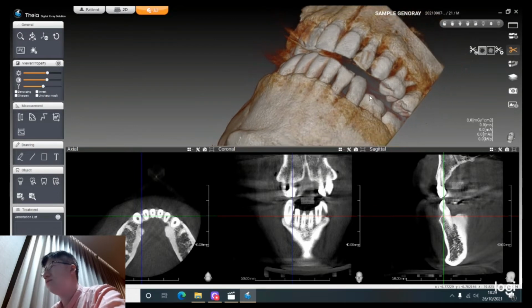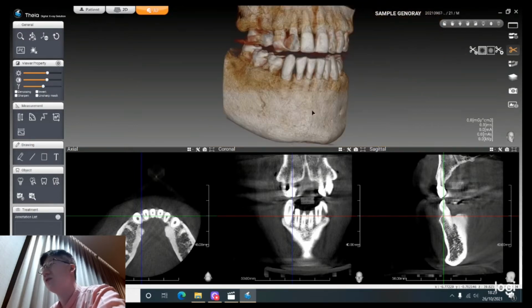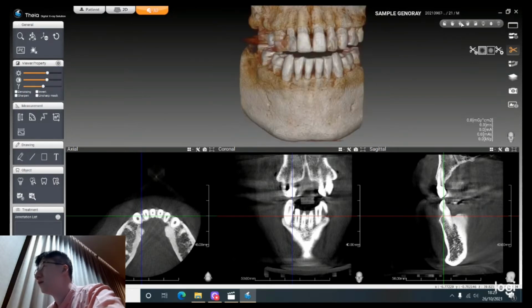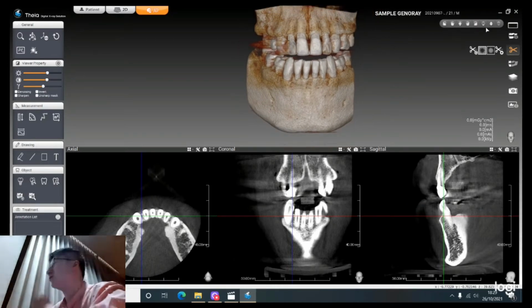Okay, so that is sculpting, and see now the picture is not centered again. Difficult. I'll just go back here. Boom. Okay, now it's centered again. That's what I found useful.